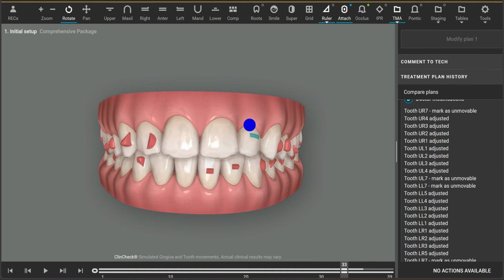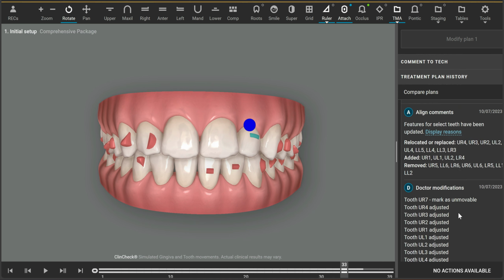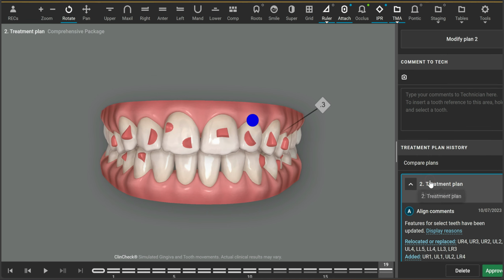Now, when you do 3D controls, you look at all the 3D controls work. It's not really specific. It just says I adjusted teeth. But I was really simplifying the posterior movements. Let's take a look at it now. After running live update and simplifying movements, there are only 19 upper active aligners. Remember, there were 40 before. This is the same treatment plan. All I did is use the 3D controls and run live update and modify the arches like I just mentioned a few minutes ago. There's only really 10 lower aligners.